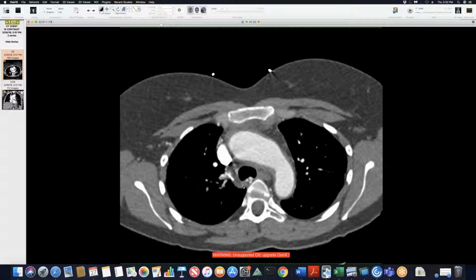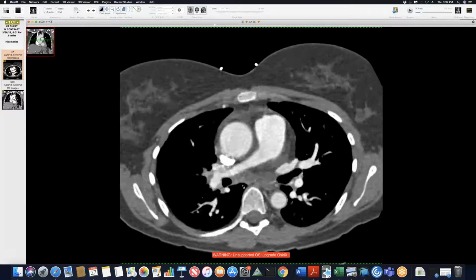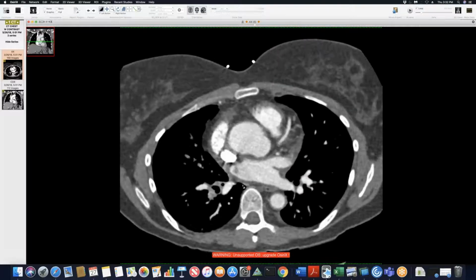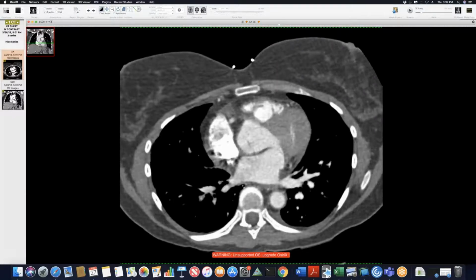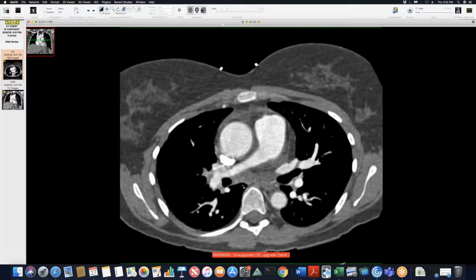Peter's case is a perfect third to go along with that because you got those nice collaterals, which fibrosing mediastinitis should not have as central collaterals because that's all fibrosed and down. You get more transpleural, and you've got those nice big juicy arteries there. But your case is reminiscent of mine, so I'll have them for next week.